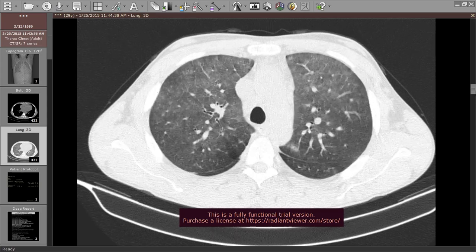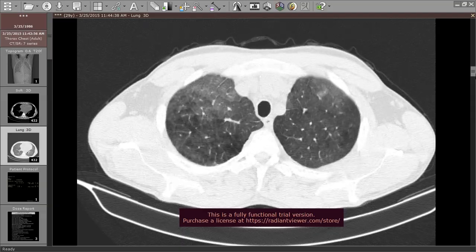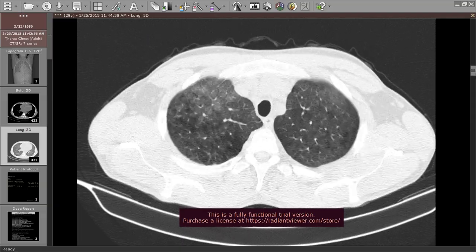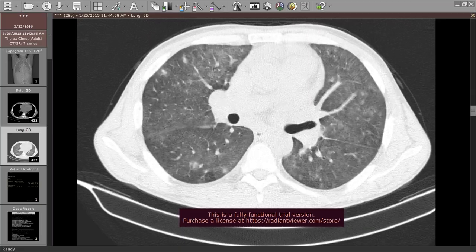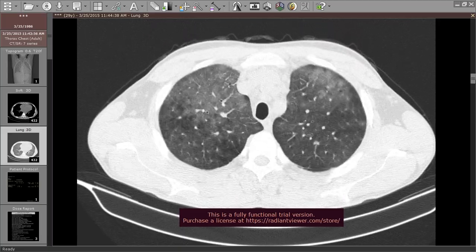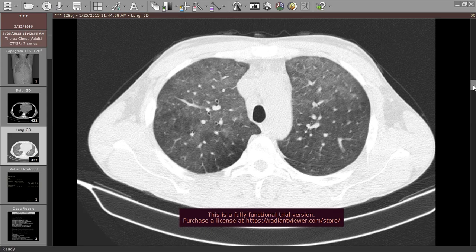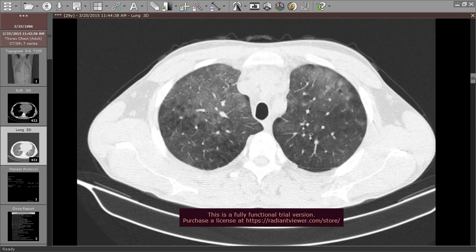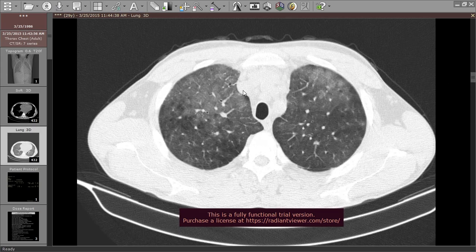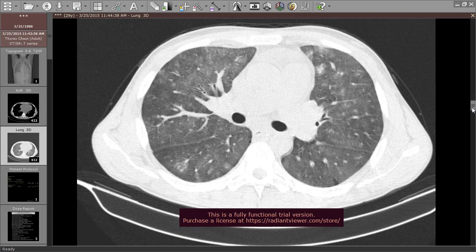First of all, it's a diffuse lung pathology, with areas of air trapping above. You can first consider the presence of pulmonary edema or pulmonary congestion, but the absence of subpleural sparing, the inhomogeneity of this ground glass material, and the presence of internal sparing as well make you concerned about alveolar hemorrhage.